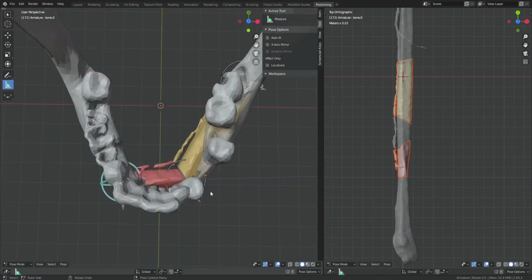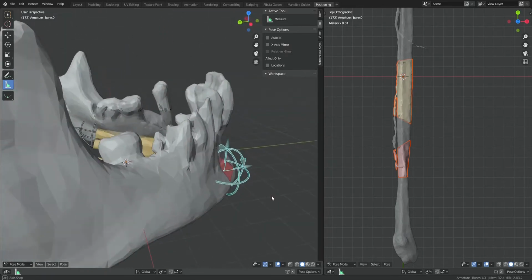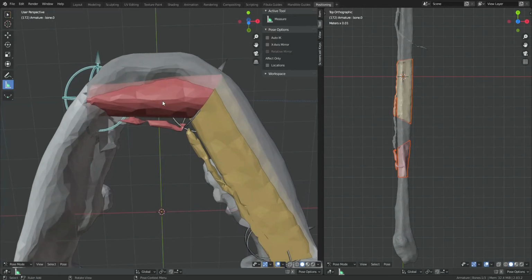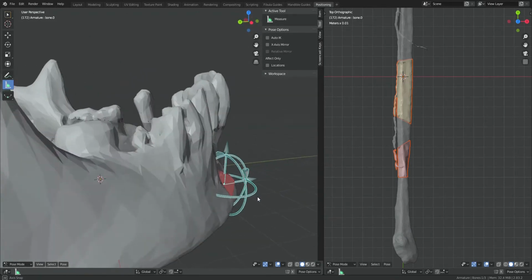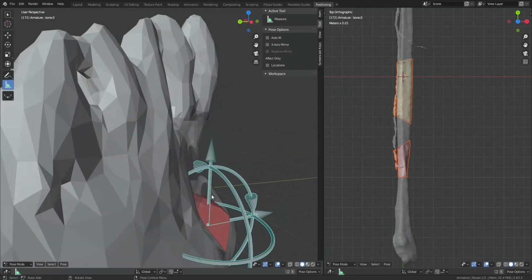So we were thinking of making 3 segments or 2, and decided to still make a 2-segment mandible. They are aware that there will be a 7 millimeter mismatch between the natural curvature and the reconstructed bone, and this part here will protrude, but they will shave it off and it will remain smooth.